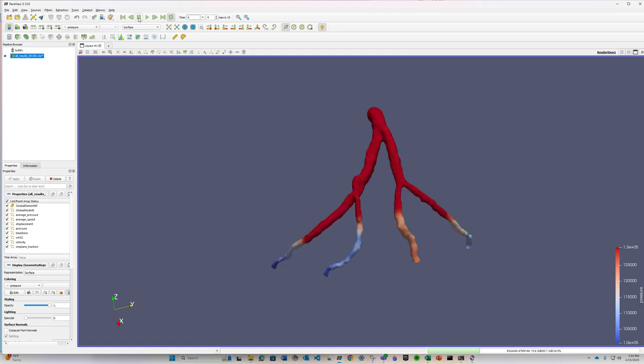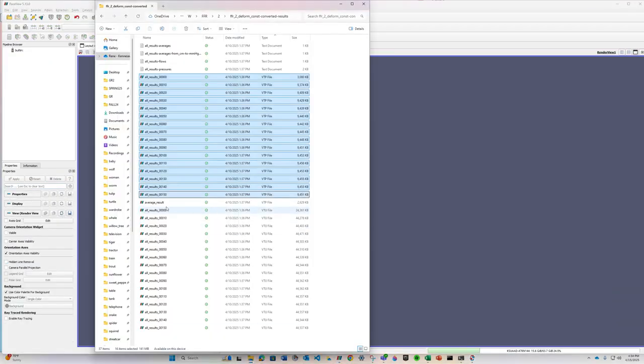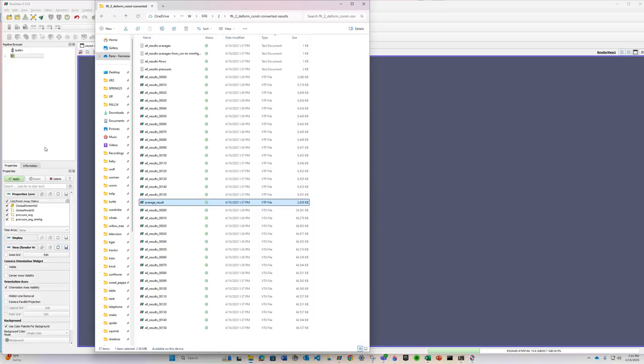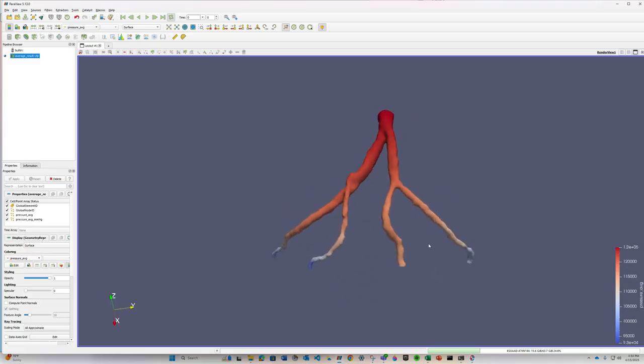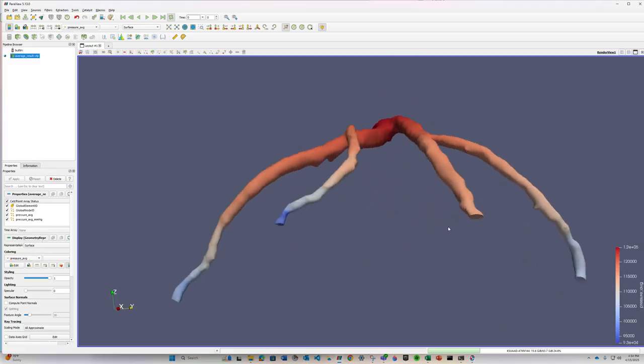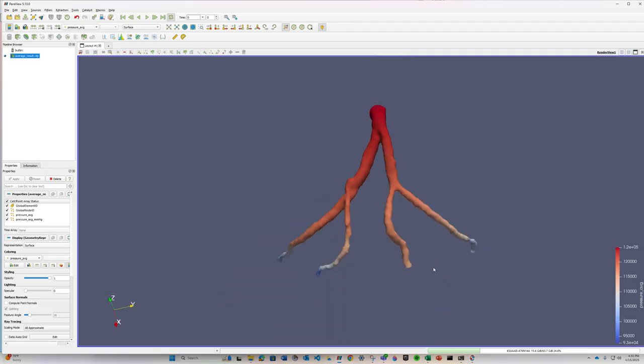I hope you think it's as beautiful as I see it right now. Very, very good to look at. But that's just for visualization. As far as the data set is concerned, what we really need is the average result. So you paste the average result in there, apply, go to coloring and choose pressure average. This is the data that we're going to use inside the data set. And that's it. You will have completely successfully completed a simulation. Congratulations.